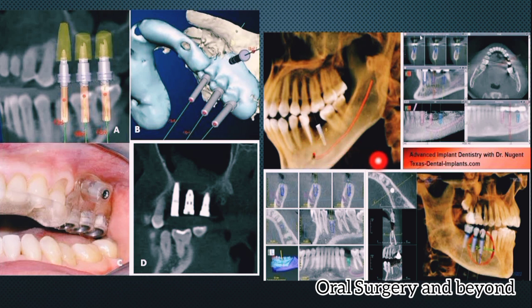What we actually do in implant planning is identify the height of the bone, the width of the bone, and the distance from the vital structure from the alveolar crest. So in this available bone, we can see which size implant can be placed, right?